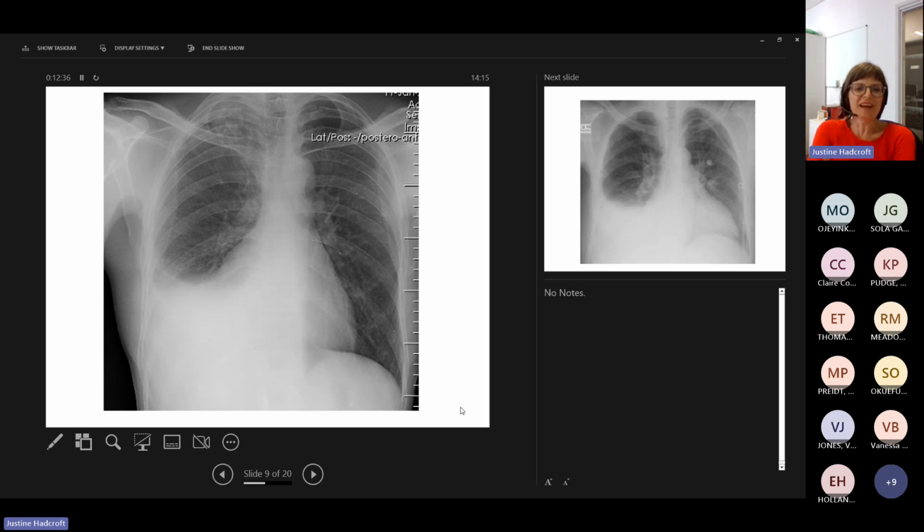This is moving on to a different pathology. So what's going on in this chest X-ray? What does anybody want to tell me about this chest X-ray? Which side is the abnormality on for a starter? The right base. It is. So we've got this whiteness, haven't we, at the right base, and you can't see the right heart border, you can't see the right hemidiaphragm. The right fissure.